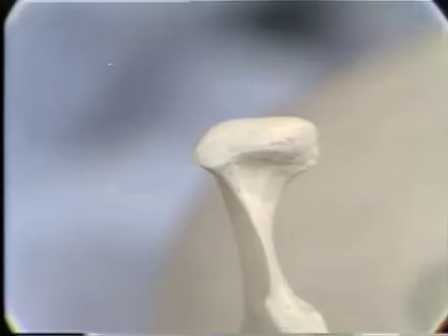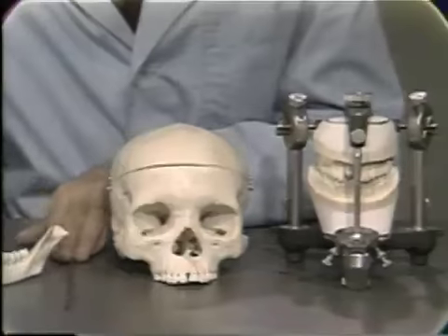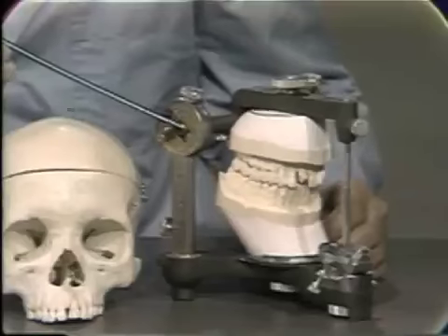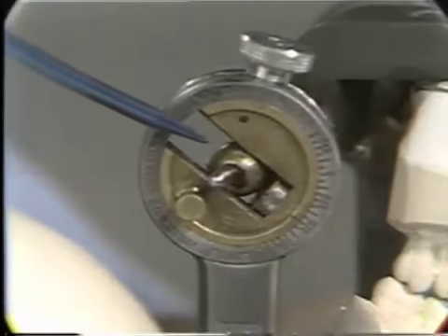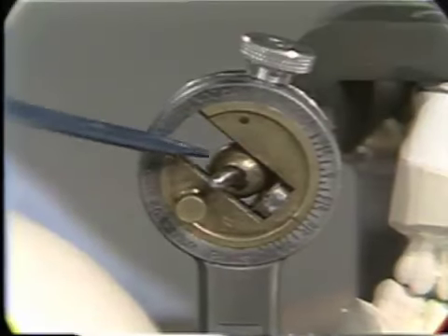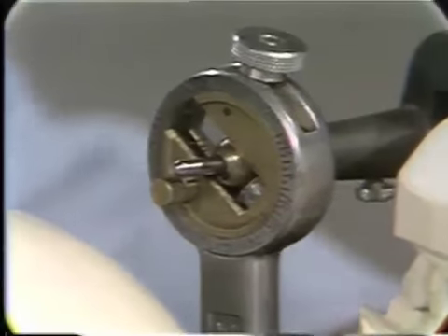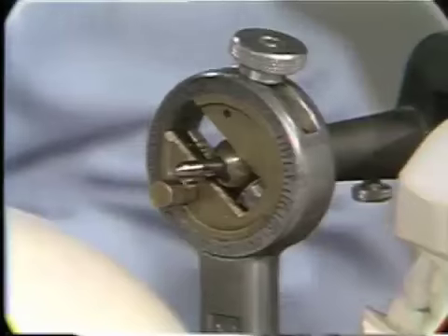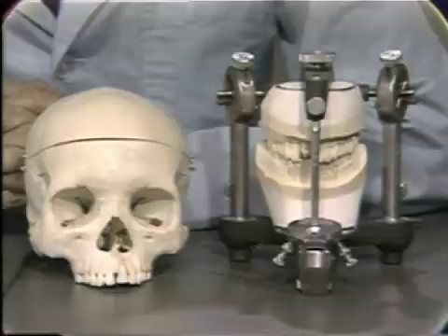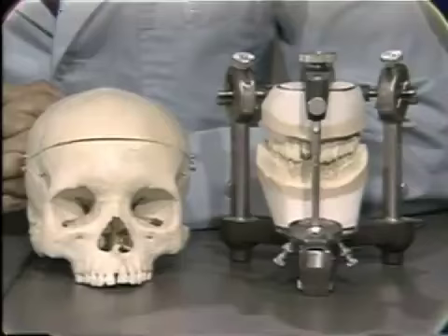We must consider that there is a disc which is covering the condyle, though, and if we look at the articulator, we would see the straight line which is the path of the condyle in the various excursions, the protrusive and balancing excursions, and the spherical shape of the ball. Now this difference in the anatomic counterparts will also cause some error, and it reinforces what we say, that the articulator simulates mandibular movements, it does not duplicate them.